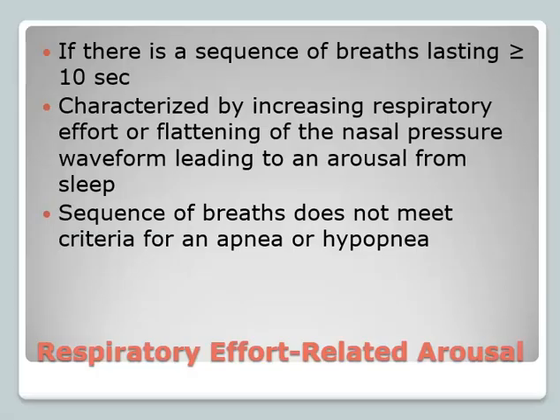So a RERA is, again, a respiratory event that has to last at least 10 seconds, but you have a very clear issue in their breathing, where you're seeing a flattening or squaring off on your nasal pressure transducer. One of the things as we continue on next year, as you get more comfortable and familiar with reading your signals, is that the shape of our flow signals can give us a lot of good information as well. When you see the thermal signal, you can't see much. But on the pressure transducer, you can see the start of the squaring off of the signal. And that means that the patient's getting some upper airway resistance as they're inhaling.